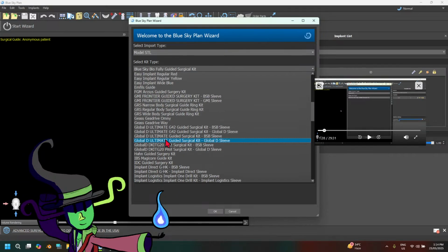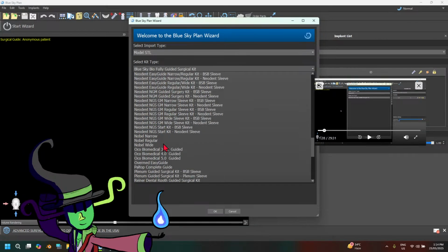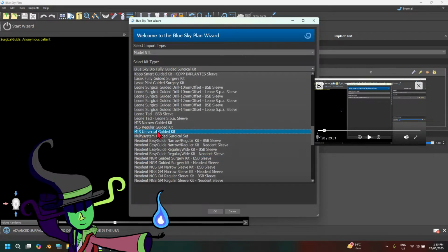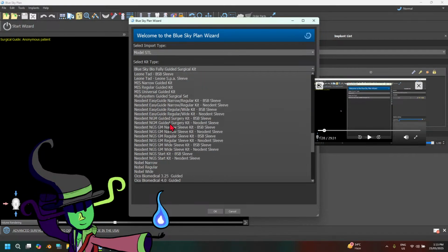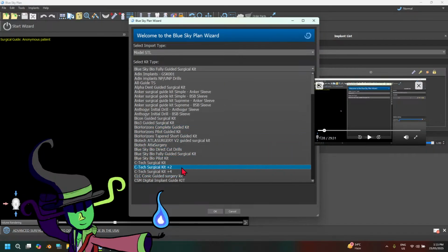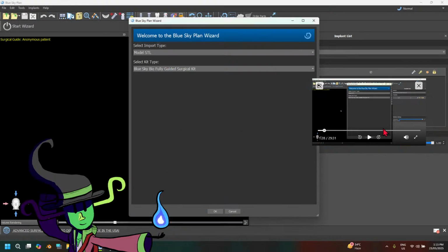Let me see. Are there any familiar ones I can see here? Is there Megagen? No. I guess they don't really have the local stuff here. How about Osstem? No. Okay, so I guess we're gonna just follow this guy's... oh, I clicked off the video there. Okay.